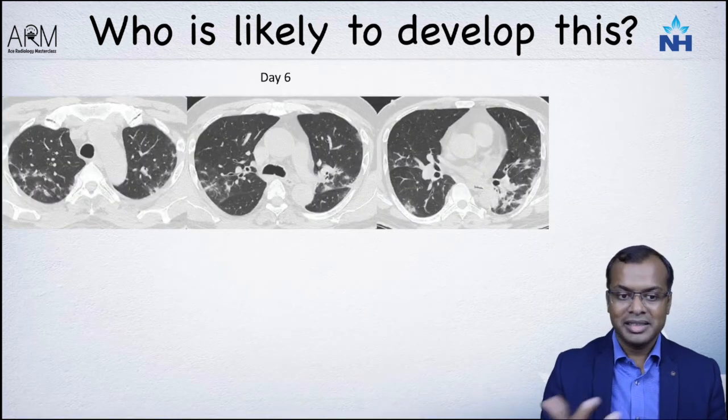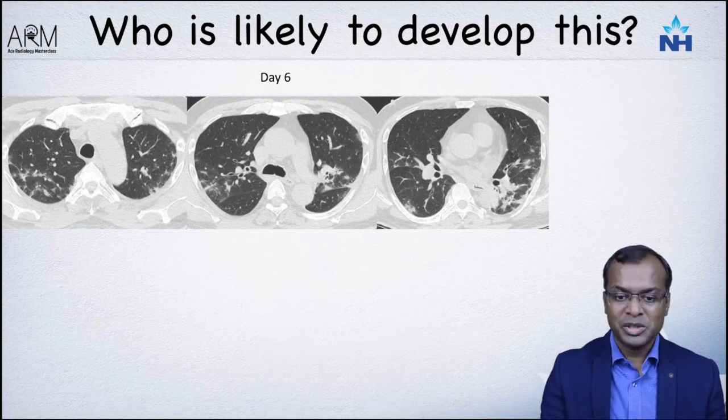Let's look at another case. This is a case from our institute where you can see on day 6 of symptoms, we can see these patchy areas of opacities.